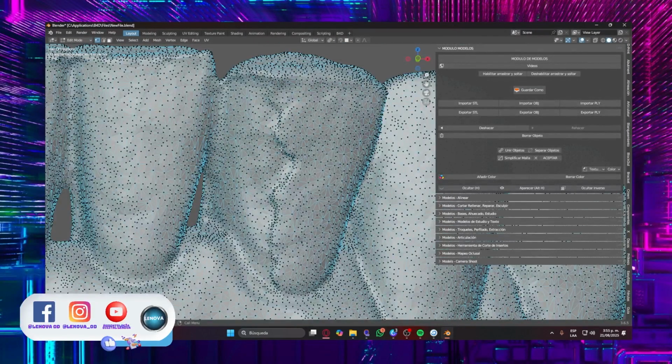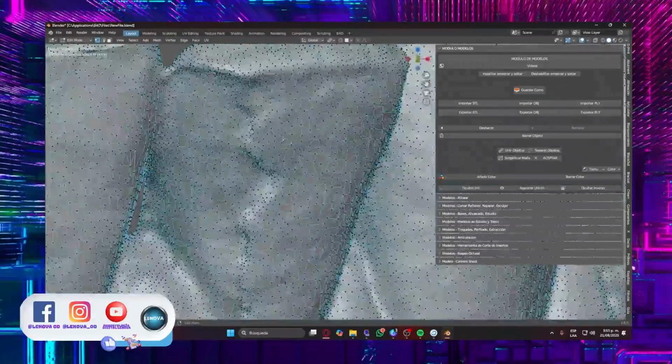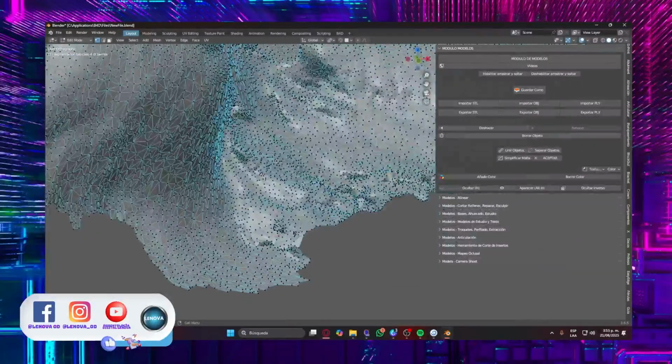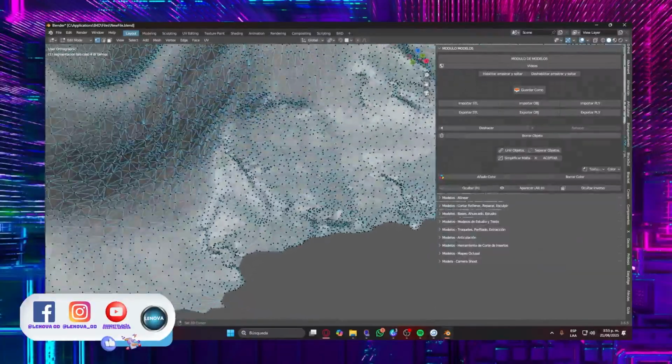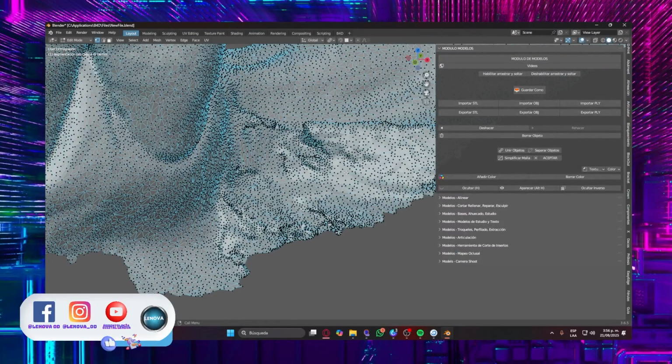case, and this happens because either it wasn't cleaned well or the light was removed. I mean, there are quite a few external factors that cause this to happen. Look here at the mesh of the folds. I mean, literally, we want the scan to align with the tomography and not generate any errors when I'm scanning with that type of quality. Do you understand the reflection I want to convey?